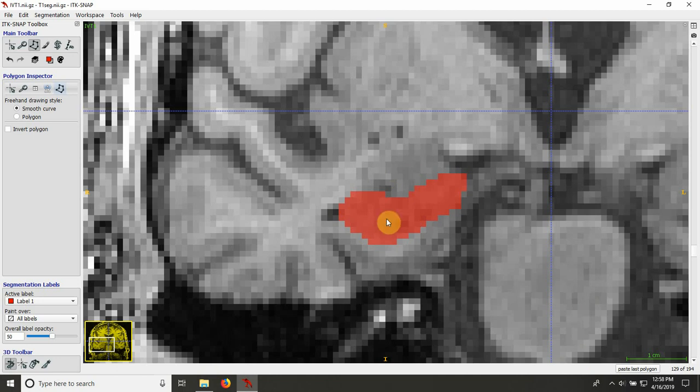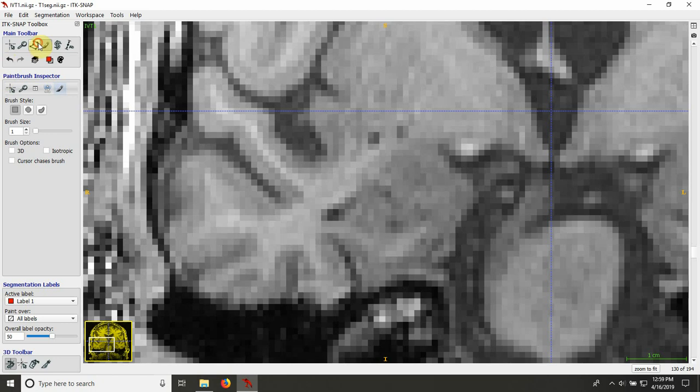So this actually, the border with the amygdala is a bit hard, and it's actually helpful to look at that in the sagittal plane as well. So I'm gonna remove some of these darker voxels that I see here. Maybe I'll leave that one. Okay. So I'm gonna go in an anterior direction. So again, I see the white matter border here, and I see these darker voxels here, these darker voxels there, and I see some more of a brighter region here. So I think that's the amygdala, that's the hippocampus.